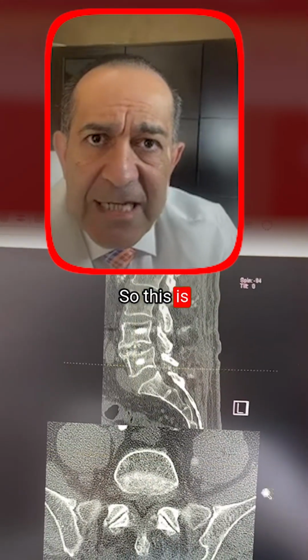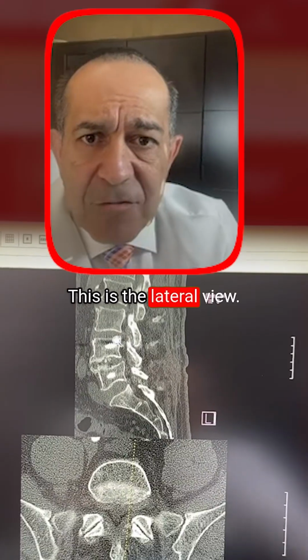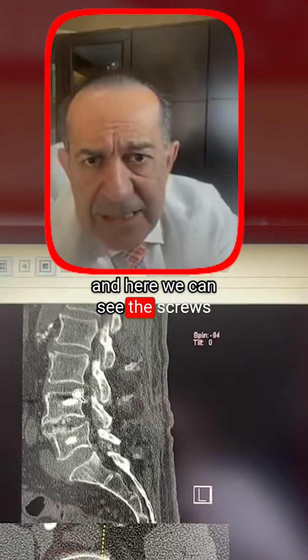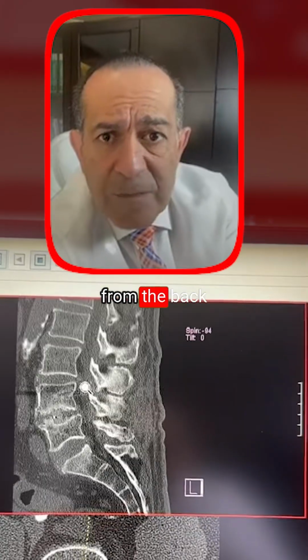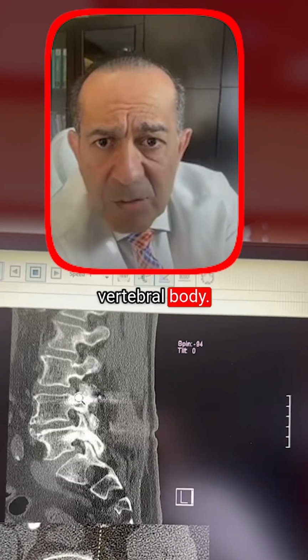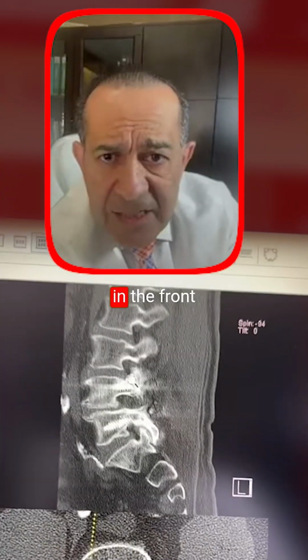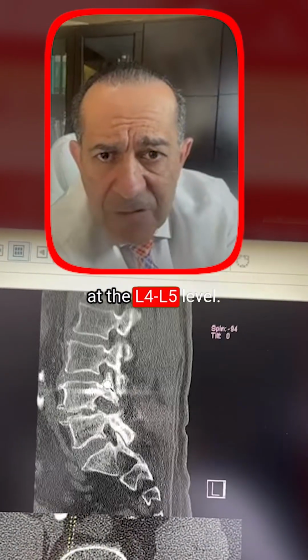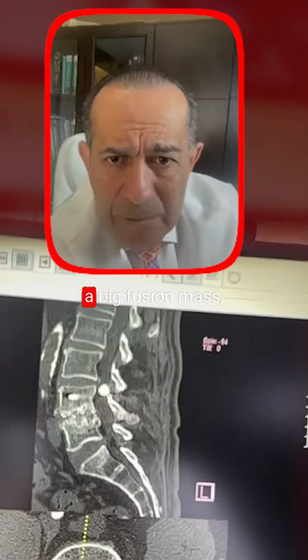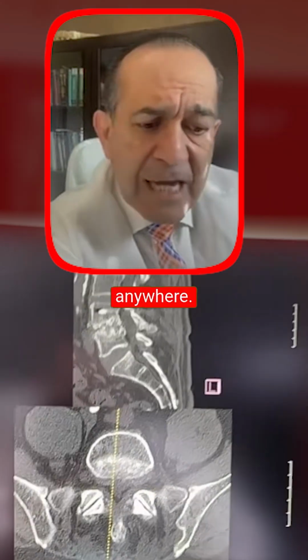So this is a sagittal view of the CT scan. This is the lateral view. We're looking at the side, and here we can see the screws that are going from the back of the spine all the way to the front into the vertebral body. The screws seem to have been placed appropriately. There is a cage in the front at the L4-5 level, and there does not seem to be a big fusion mass, and I don't really see a solid fusion anywhere.